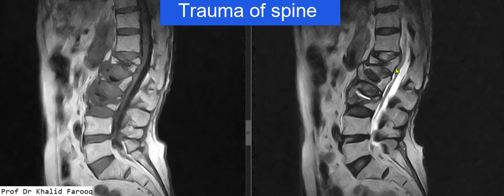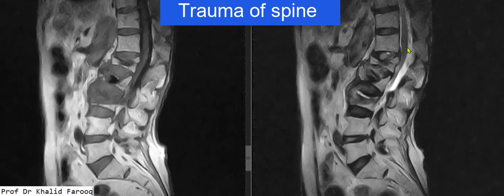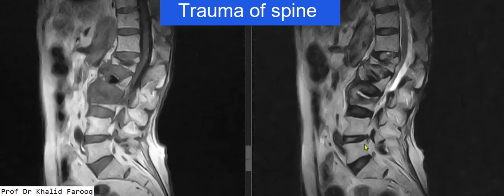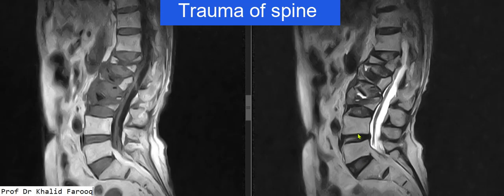Tiny bulge of upper portion of posterior body line is noted in L1 vertebra, and in spite of these changes, we see the bony canal posteriorly is capacious, and lower dorsal cord including conus is unremarkable. There is no soft compressive disc disease at upper 3 disc level, although tiny disc bulge is noted in L4-5 disc.